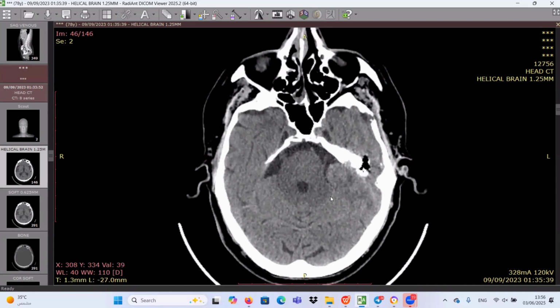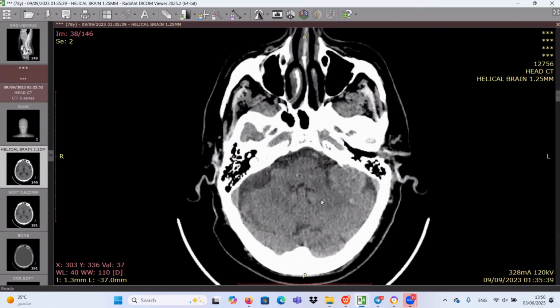Yes, you are right. Unfortunately, I don't have a contrast enhanced study because when I reported this case, I requested a contrast enhanced MRI or at least a CT scan, but really I don't have it. The patient didn't comply with me. But what's your opinion? What's your differential diagnosis in this case? Because this is an interesting case.